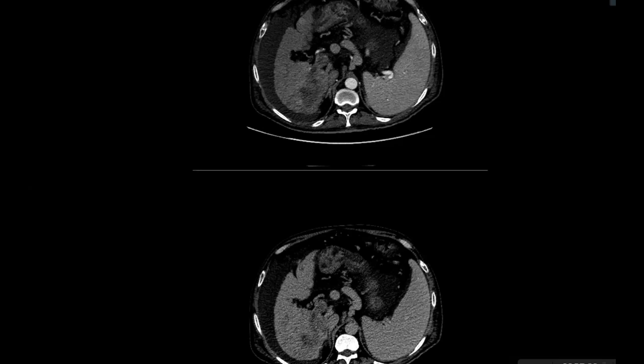So in summary, please summarize your finding. Sir, although in the background of CLD I'm strongly suspecting hepatoma, the appearances are not typical. Yes, the lesion is also showing arterialization. So I think this is multifocal hepatoma. So can you summarize? So multifocal HCC showing irregular arterial enhancement and washout on the delayed images.